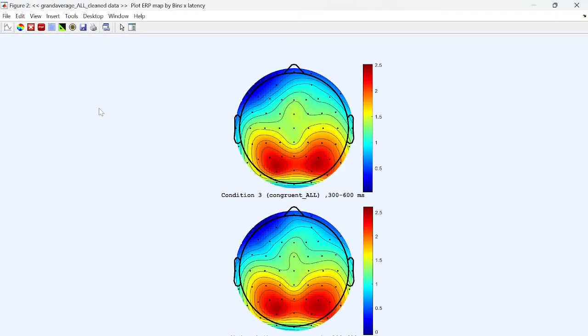And here you can see that I've got fairly standard looking, almost journal ready topography plots. Again, as before, you can File, Save As, and choose SVG, and this will enable you to edit by right-clicking in PowerPoint and selecting Ungroup.